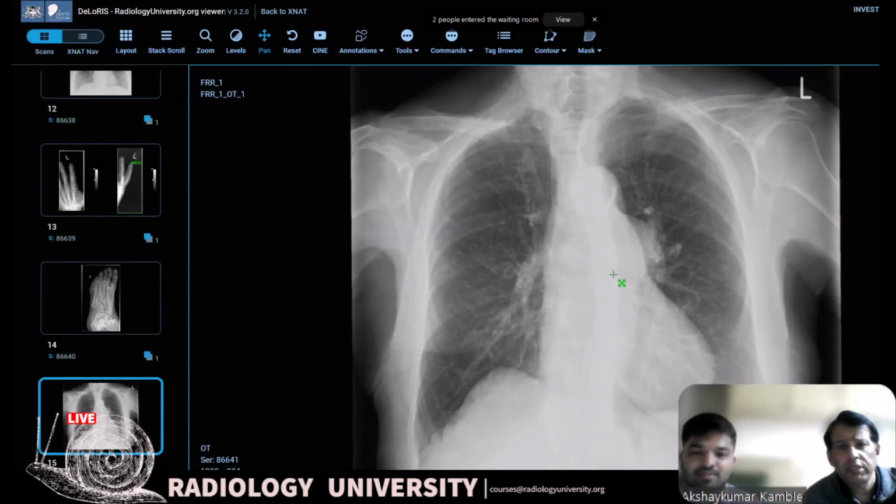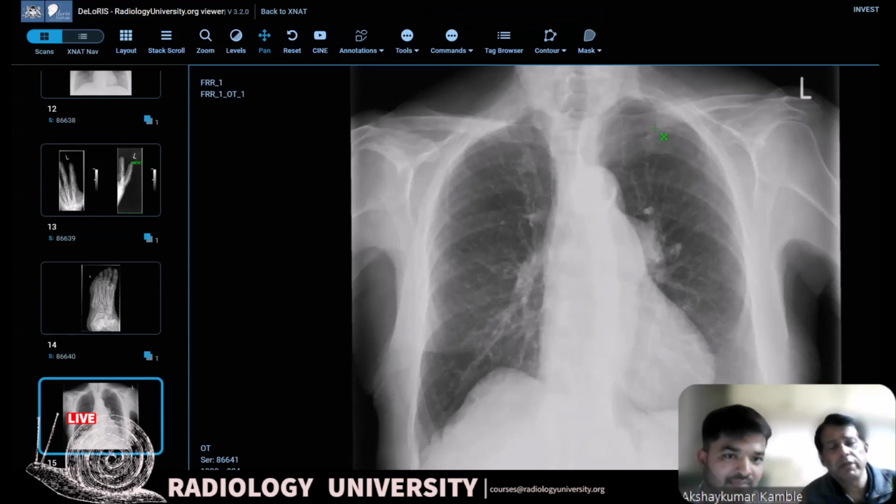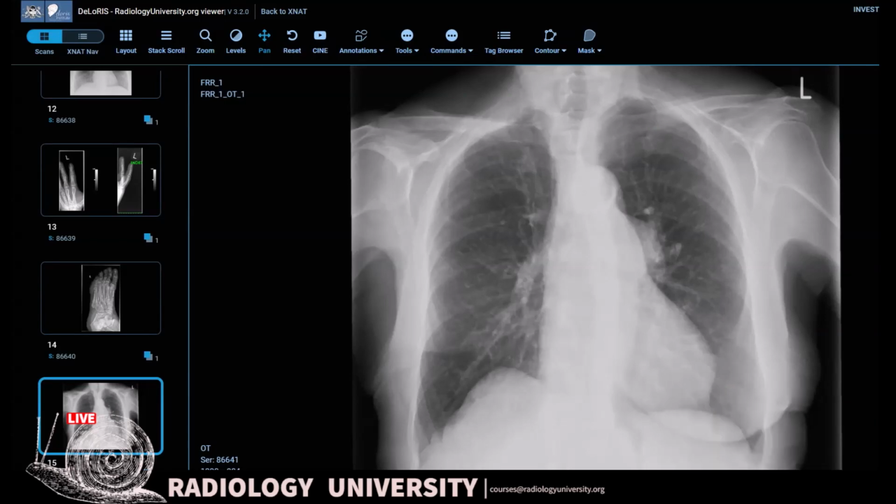So this takes some time. Does somebody want to pick up this one? I think someone should present this. Does anyone want to present? Or should we just say this is? No, I think let someone. It's a good scan. I think we'll just wait for someone to present, or I will just call out. Okay, yes. Catherine, you should present this one, because I think you had picked up both of those findings when I was correcting it.